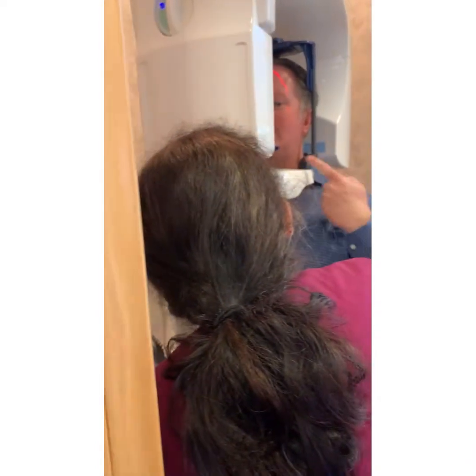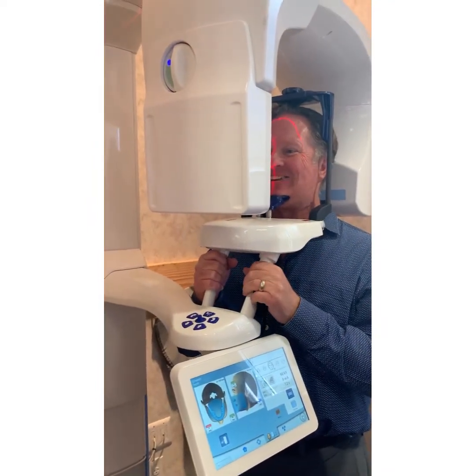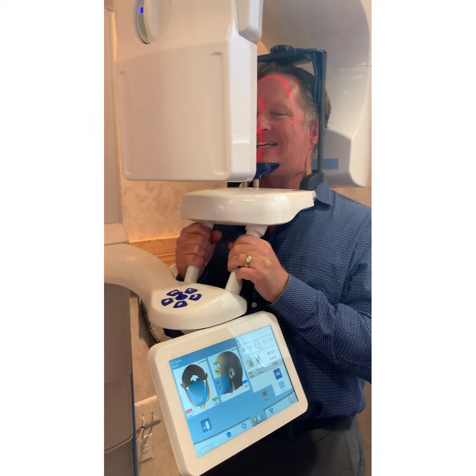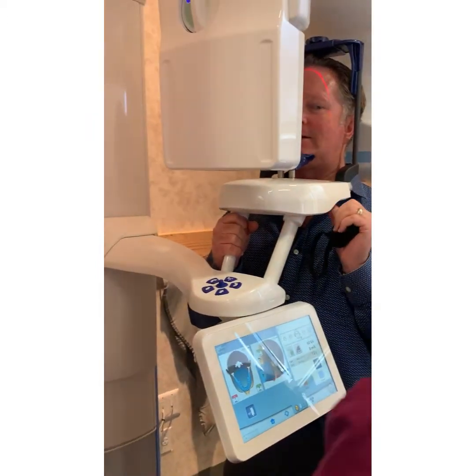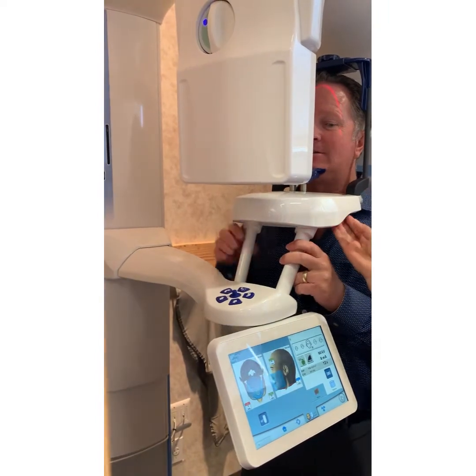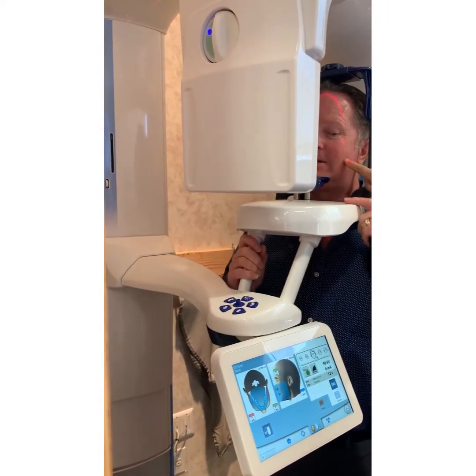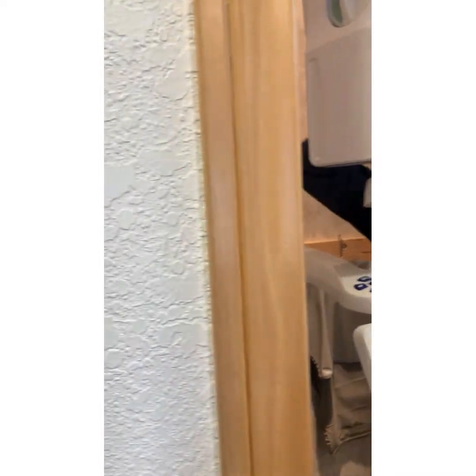That's how the whole thing moves. That's for 3D. Now you're going to be looking from 90 degrees, and you're going to move this line right in front of 8-9. Not on it, not behind it, right in front of it. Go ahead, use the wheel. No, this line right here. You're going to move it forward. It's coming out here, not this line right here.